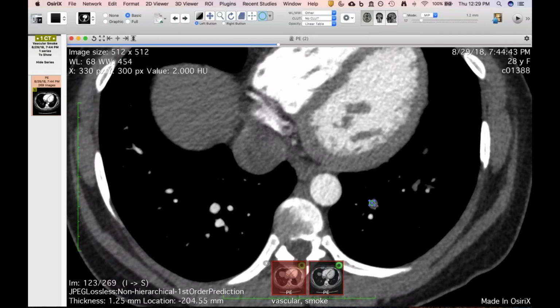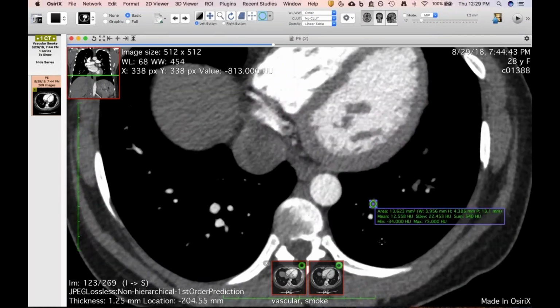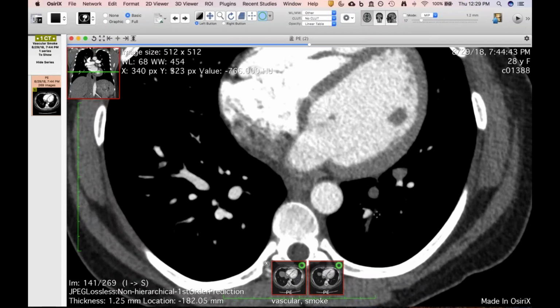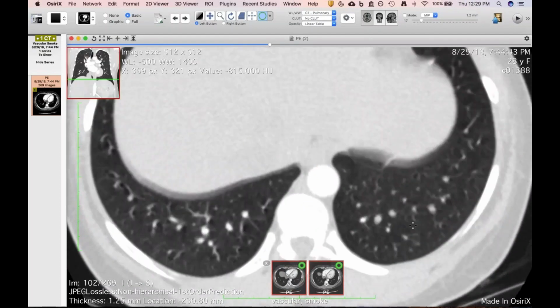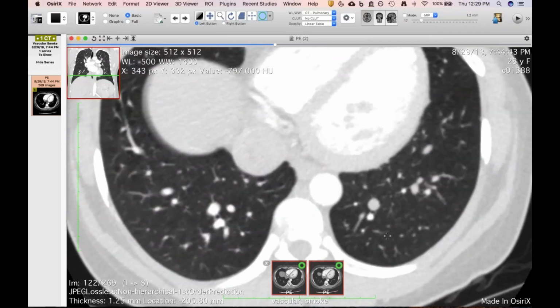Usually, as you guys know, I'm the first one to think that things are going to be just flow artifact, but this is so low, you almost wonder. I don't know, have you guys seen this before? Has anyone seen pulmonary vein thrombus as a consequence of pulmonary arterial embolism? She's hypercoagulable because she's postpartum. The thing that would argue against it being occluded is the fact that there's no asymmetric edema in that area. But I don't know.